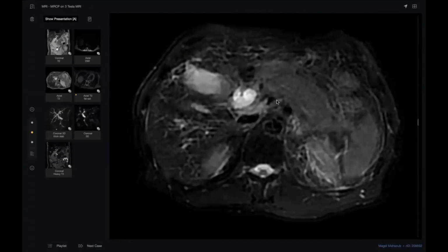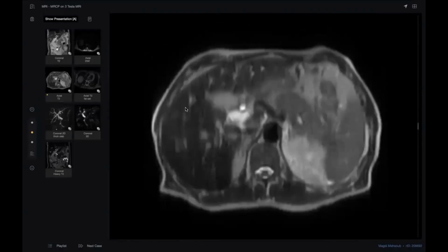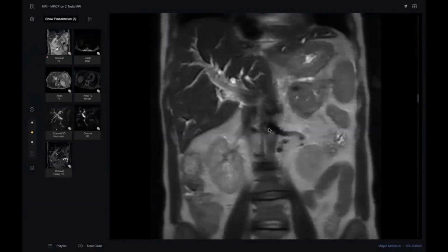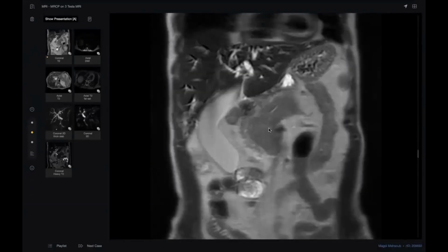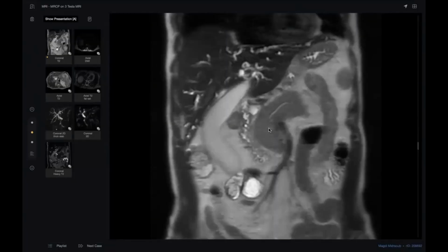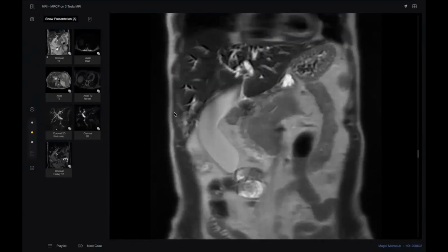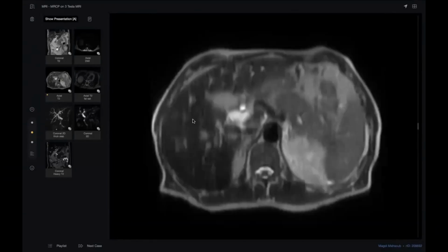What happened here? Here. This is the anatomical site of the pancreas. What happened here for this organ? Sir, this is the pancreas, which is dilated, showing marked dilation of the pancreatic duct, and the pancreas is diffusely bulky and hypointense with irregular peripancreatic fluid. So this is associated with pancreatitis. Okay, and what type of pancreatitis? If it's an autoimmune disease, then it's autoimmune pancreatitis, resulting in marked dilation.